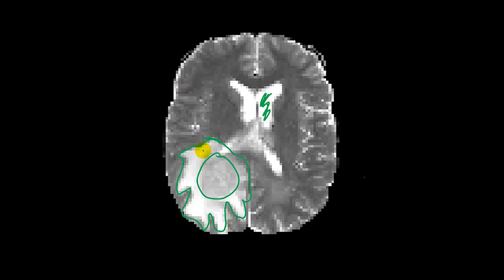So anything based purely on intensities, like thresholding, simply won't work in this case, partially because of noise in the image, partially because the intensities don't match, and partially because of effects like these over here. This is a challenging case of image segmentation that exemplifies the need for sophisticated methods and algorithms.